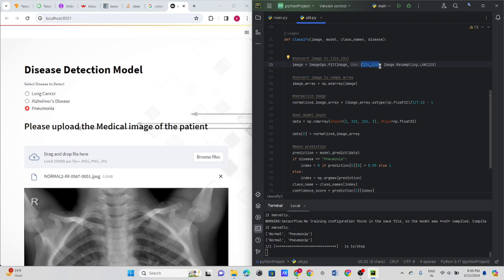This 224, 224 is not actually the size, it is the number of pixels length and breadth wise. There can be cases where we have three-dimensional pixels, which we call voxels. We can see such problems in the case of 3D lung tumor segmentation. But here we have simple three diseases which require only 2D, two-dimensional pixel coordinates. Okay, so an image is made up of pixels. Just imagine an image made up of small Rubik's cubes, and there are 224 Rubik's cubes in length and 224 Rubik's cubes in breadth.